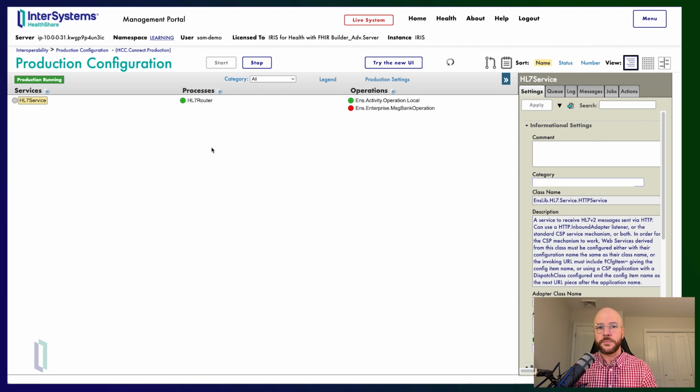That's now here in our protected read-only namespace because that merge request was successful and pushed through by the maintainer. So now Sam has basically been able to do his interface work in his interface branch, get it into his dev environment, and this is where he can do more testing against other things that have been promoted to dev already, make sure everything looks good, and if there's no changes to be made, he can continue this process by merging into test and eventually merging into live, ensuring to follow the organizational workflows and best practices that your organization has outlined for your Health Connect Cloud source control strategy.